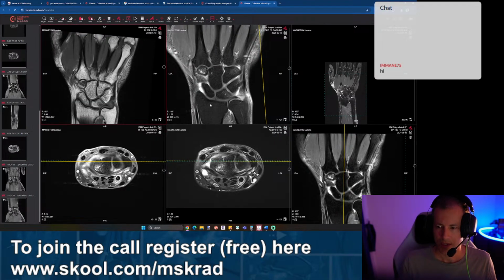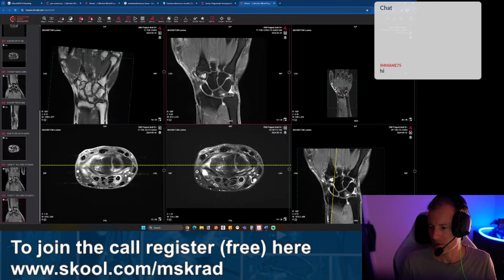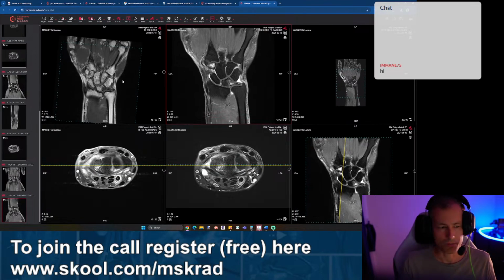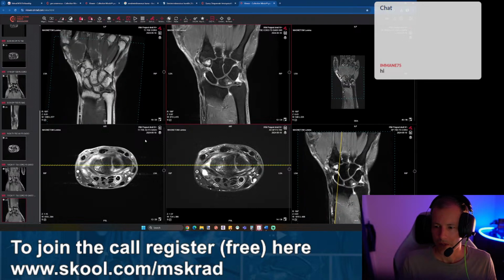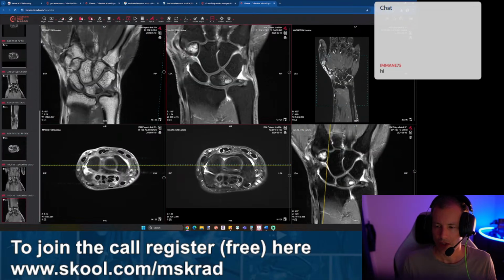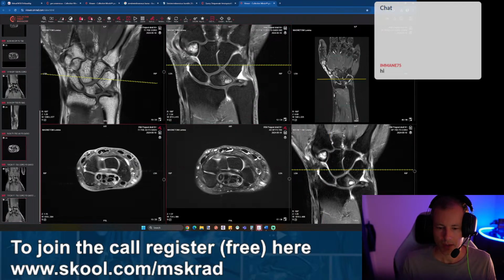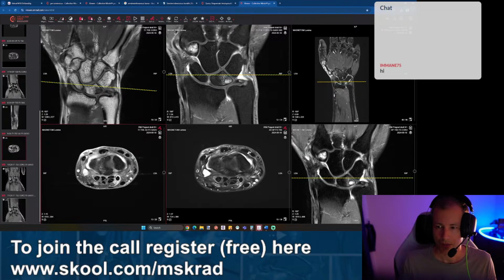We've got synovitis. We've got some additional degenerative change potentially from a mechanical conflict, but this is suspicious for an inflammatory background disease like rheumatoid arthritis, or any other form of these diseases, especially because we have also tenosynovitis. If you just have synovitis and we have these changes here, chronic mechanical impactions can lead to synovitis. Also instability can lead to synovitis, but here the extensor and especially the flexor tenosynovitis is not explained by a conflict between ulna and the proximal carpal row.